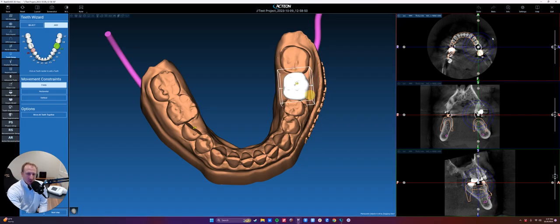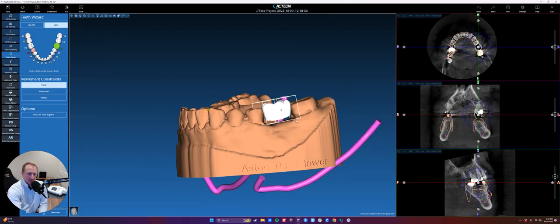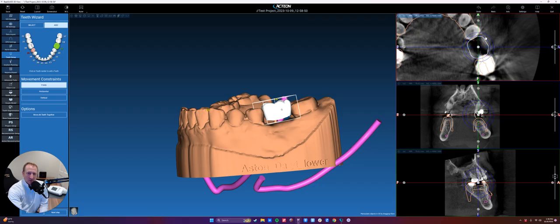It's easier to navigate that tooth in these slices on the right though. So it's nice to see the rendering to make sure you like where it is. But let's go ahead and showcase how to use it on this. So in the axial slice, if I zoom in with my right mouse button, I can grab the middle of the tooth and drag it around just the same. A little bit more controlled, however. And these blue circles allow me to click and twist this tooth around. Okay, so it's already in a pretty good spot, so we'll leave that be.